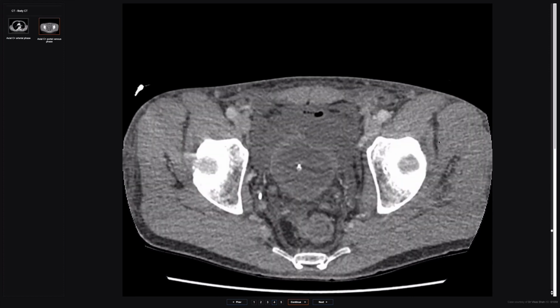So I think it was finally suggested to them that you should be thinking about a bladder injury here because that's what really naturally fits with his story. The fact he's got pelvic bone injury, he's got a lot of free fluid, and he's got no solid upper abdominal injury.